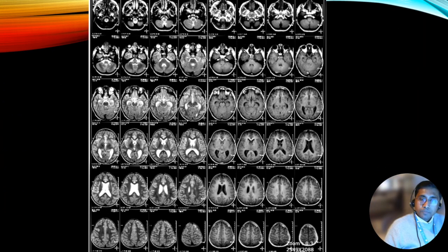Right. So this is basically a child who came with complaints of chronic headache. I apologize in advance for the quality of images here. This is the first scan the child had, and it was basically reported as normal except for some prominence of the ventricles here. So no lesion was identified at that point. And this is an oncology talk, so definitely we are going to have some lesions at some point, isn't it? This child was treated as idiopathic intracranial hypertension because of the chronic headaches.